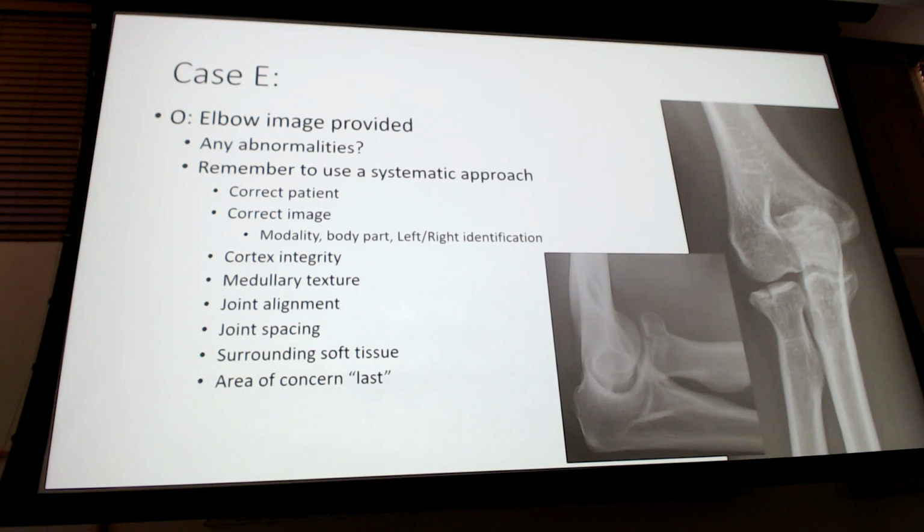I'm going to use the light to highlight it because my next slide just has the diagnosis. Right here. Everybody see the radial head fracture? Here and here. If you look closely, maybe there's a posterior fat pad, but really that's probably going to be more up in this area. Hard to see because this image is clipped, but I then challenge you with this question. Do you even need to look for a posterior fat pad sign on this image? No, because the fracture is right there.